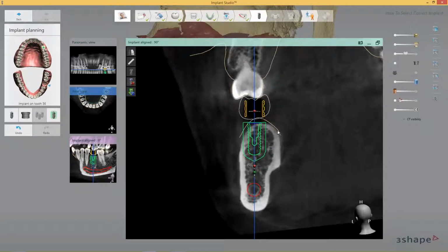We also see the outline, the surface of the intraoral scan from the TRIOS. That's my soft tissue contour level that I have on that brown outline. That is correct, and just in this section, here we don't have a tooth, we actually have soft tissue. So this is the outline. But in the upper jaw there is a tooth, so here we can follow the tooth instead. If I zoom in or out or pan through these sections, we can actually come to a tooth and so on. So this always describes what the TRIOS has seen.